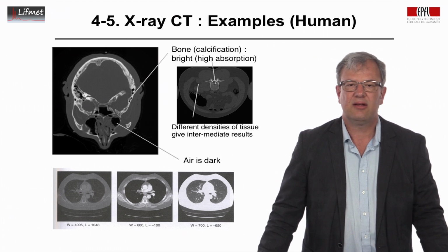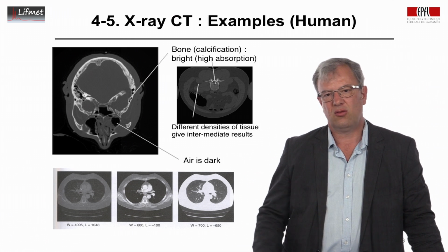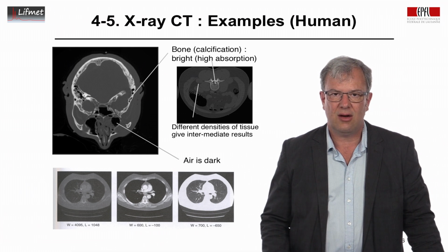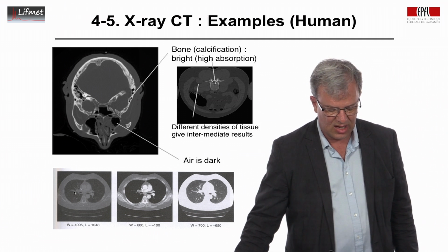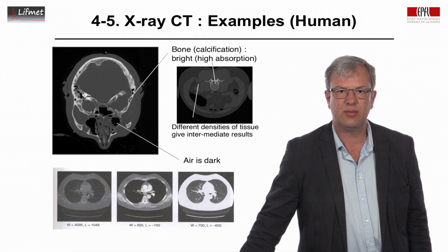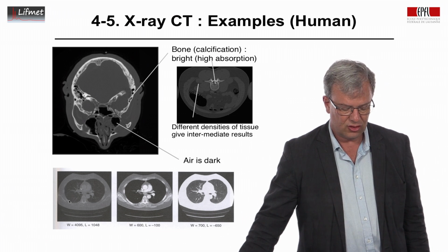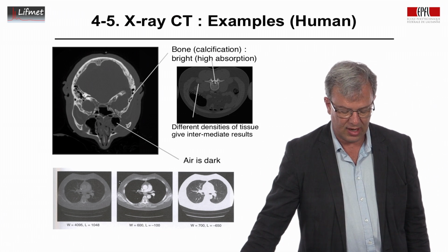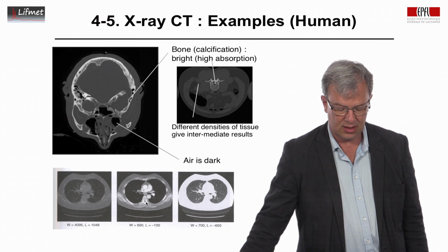Now I mentioned earlier that the Hounsfield unit allows us to quantify the pixel intensity. So the operator can set the pixel intensity on the computer display to depict different contrasts. Here is the same image displayed in different ways. Here is one way, we don't really see much. It's relatively grayish. And here is a different highlight, and we're seeing very nicely the rib cage here, we're seeing the spine back here.